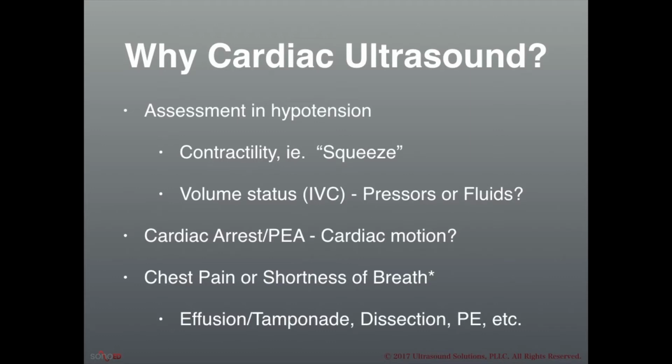We'll also use cardiac ultrasound to evaluate patients in cardiac arrest or PEA. You will use ultrasound a lot in your practice to help work up the cause of cardiac arrest or PEA. But one of the first questions you want to know, particularly in patients with PEA or asystole, is to confirm the presence or absence of any cardiac motion. The prognostic value of ultrasound to confirm the absence of cardiac motion in patients in cardiac arrest is very valuable, because those patients' survival to discharge from the hospital is bordering on zero.